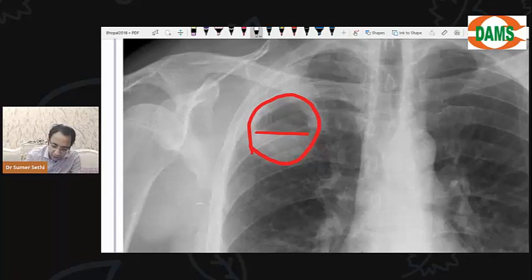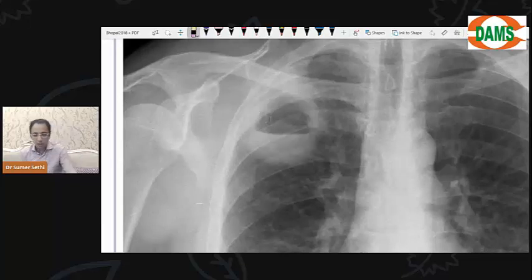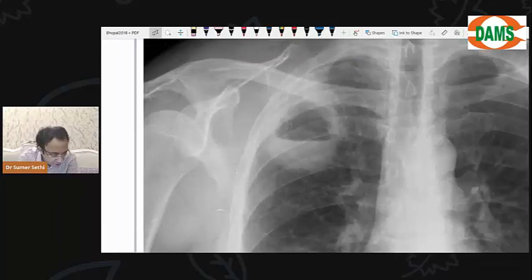Okay, so in the lung abscess, you will see an air fluid level. But in hydatid, remember on the air fluid level, we saw the daughters floating. Then we called it water lily. So this is how a lung abscess would look like. It would look just like a cavity, but you will see a clear-cut, well-defined air fluid level, then we call it lung abscess.